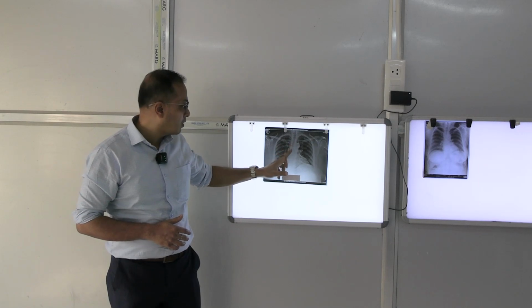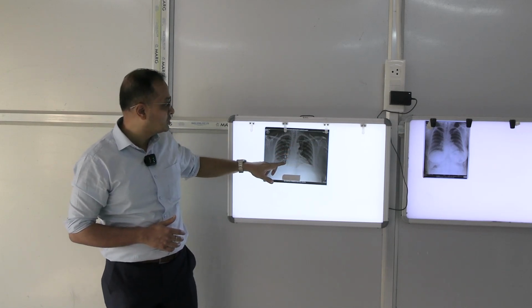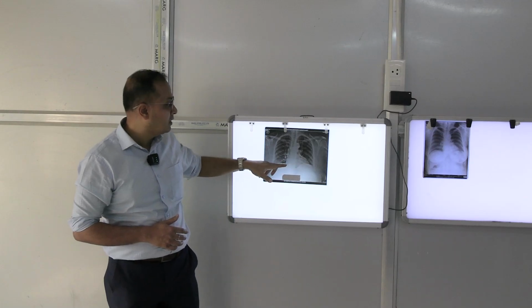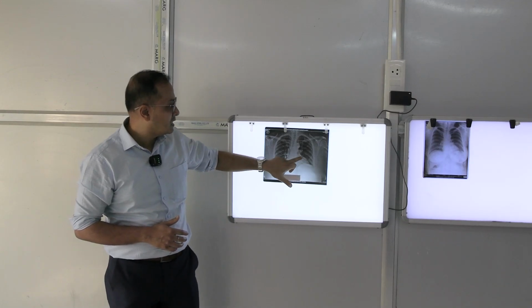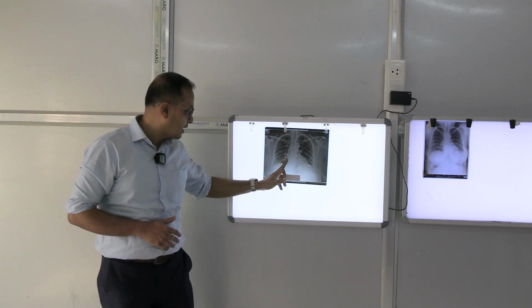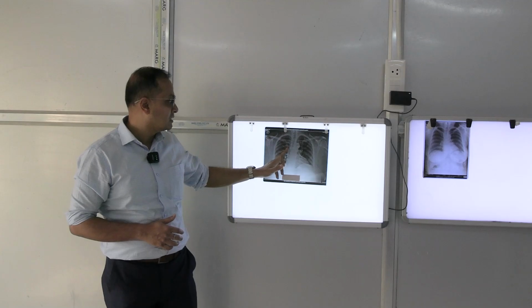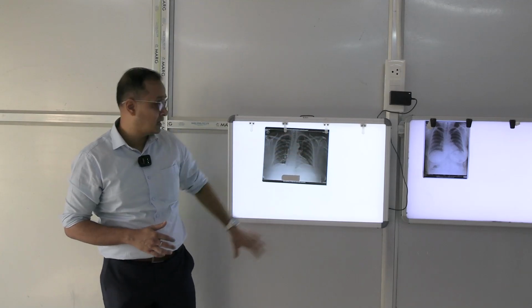So this is the right border of the heart, which is hanging down here, as well as the inferior border of the heart, which should be lying here in the middle of this mediastinal surface, joining these angles out here. So this is the left ventricle, which is making an impression like this on the left side. This should be the right ventricle, which is arching over here, and this is the right atrium. This side will be the left atrium. How it is making out here.